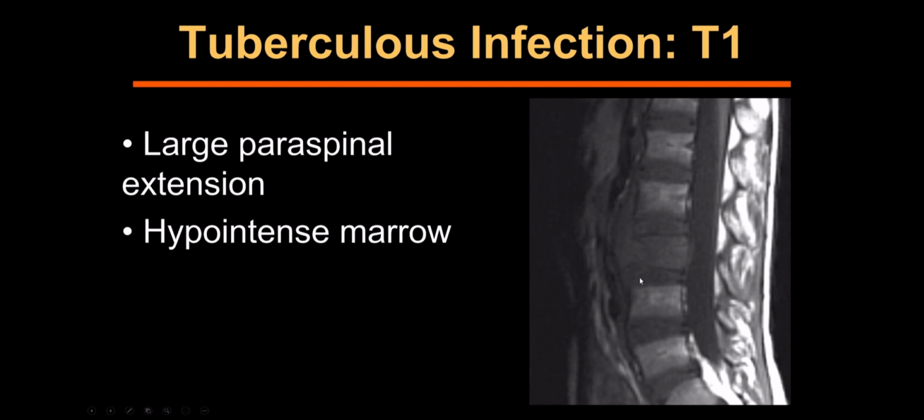And I'm thinking about a malignancy, right? You've got marrow replacement. End plates look pretty good. Intervertebral disc's not bad. Hey, we all know that malignancy can spread to the paraspinous regions, and a lot of these cases go to biopsy.